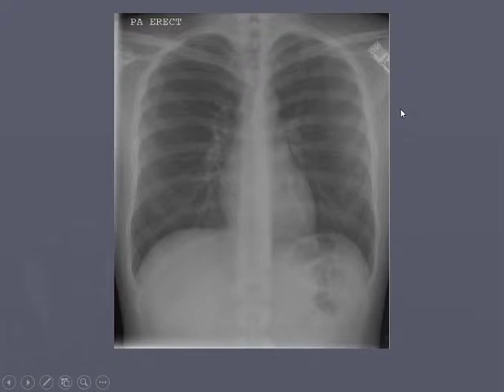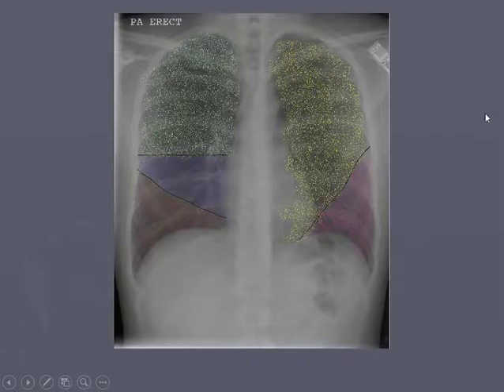So again, looking at our sample patient, lung fields, left lung field, right lung field. Pretty easy to see. But they're also divided into the different lobes. We have our right upper lobe, middle lobe, and lower lobe, as well as our left upper and lower lobe. And hidden in here is the lingula, which is the small little appendix-like portion of the lung, our vestigial lung that was crowded out by the heart when the heart formed, and that takes up that space.